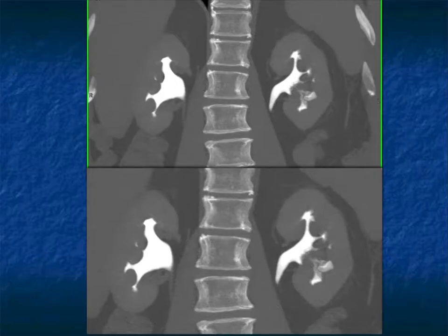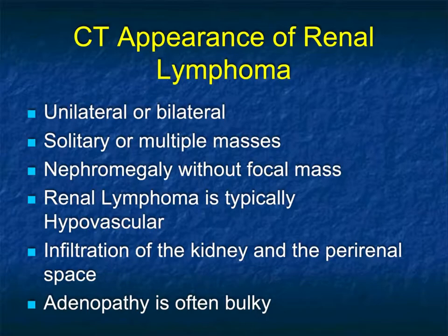This is all the tumor, the blunted calyces, as well as amputated calyces to the lower pole. And again, here's just a few more views of this. Very classic. And again, in the TCC lectures, I emphasize the importance of MIP imaging, sliding MIPs, 10 to 15 millimeters thick, to look at calyceal abnormalities. The last thing I'll mention is lymphoma.